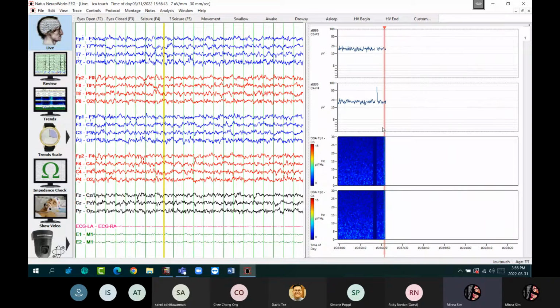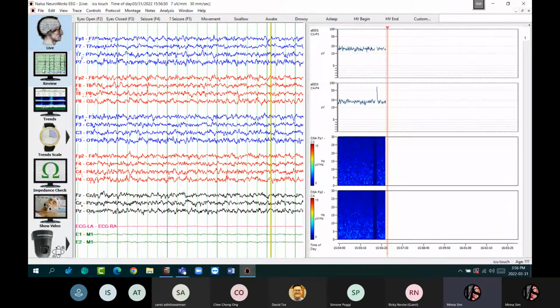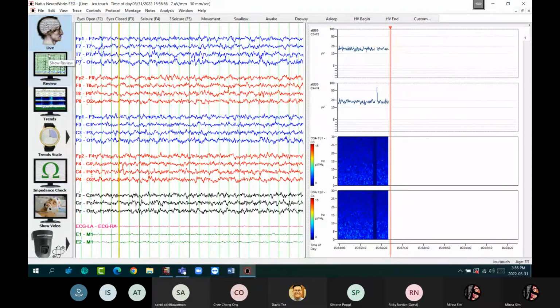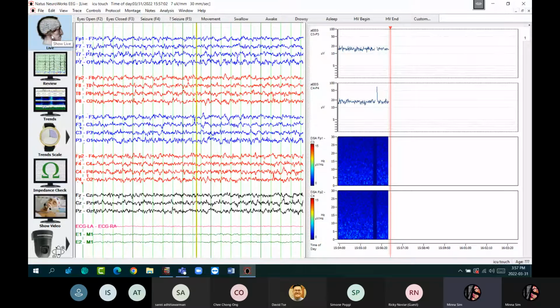We try to minimize the number of things on the window and only show the bigger icons over here that are commonly used. So this is pretty much how the ICU touchscreen mode works.